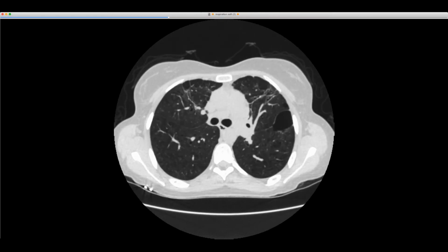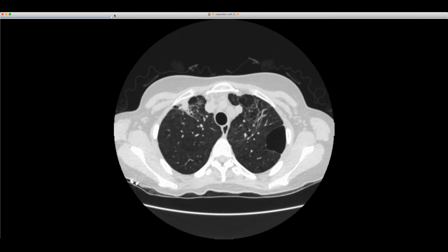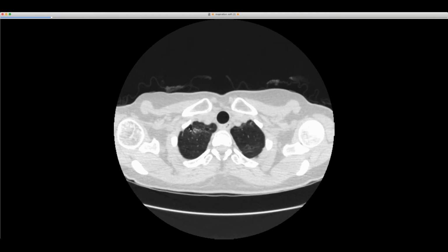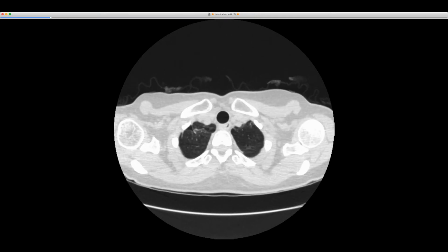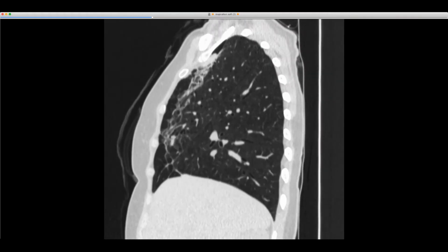Let's go back up to the upper lungs. You can see that this is not really a bulla, but more of a loculated pneumothorax. And you can see that this up here is part of a loculated, resolving, tethered anterior pneumothorax. You can see that better on the sagittals here. Let me show you, sort of in this area.